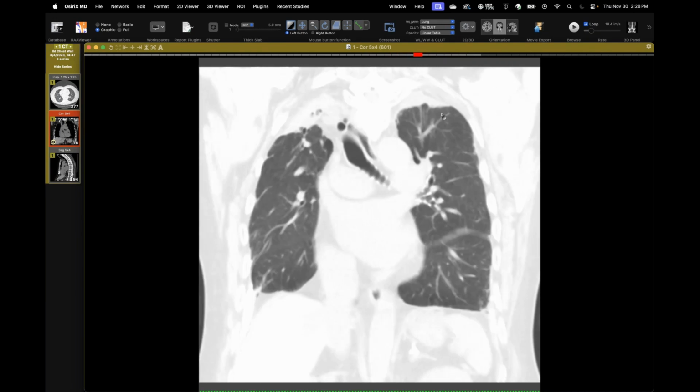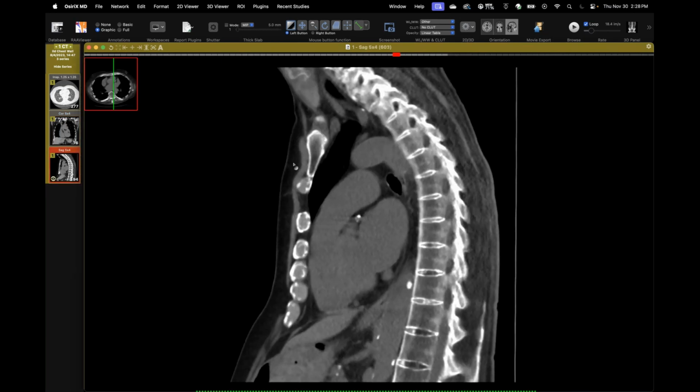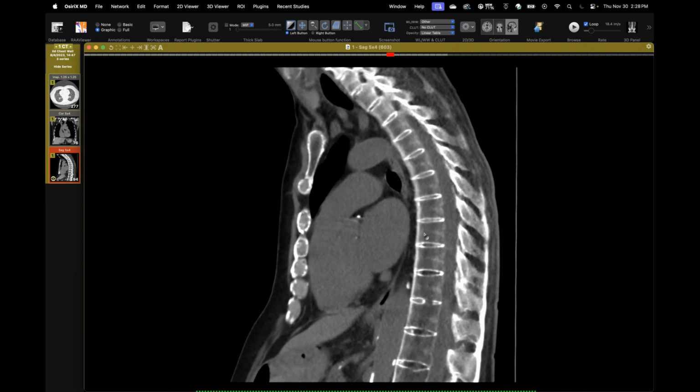And this actually had been stable over many years. I think we had a CT from 5 years back that showed stability to this. And you can see he's not very kyphotic, so he fused more upright, which of course helps with respiratory function. But I don't know if it's related or not, but it's talked about. I think Ank-Spon's probably managed much better nowadays, so maybe that's why we don't see it. But I don't know, David, have you come across a case like this?